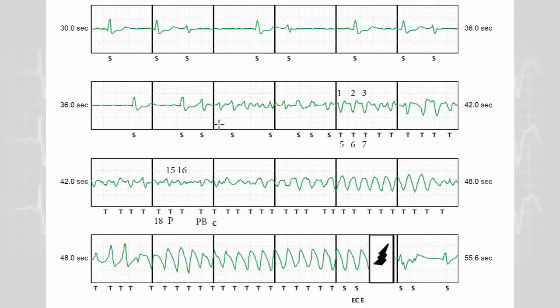Now let's analyze in detail the phase preceding the charge. I have added some markers to explain the different counters. During an episode of ventricular fibrillation, like in this example, there is always a delay before the occurrence of the first T marker, and this for two reasons. The first one is that the device calculates the heart rate as the average of the last 4 intervals. So you need at least 4 correctly sensed short intervals before the first marker T.